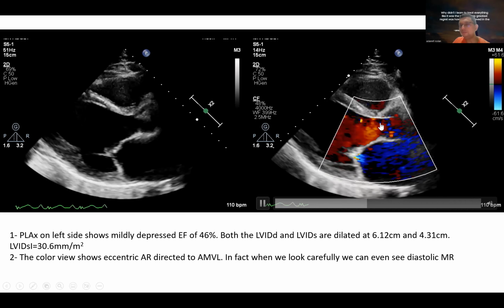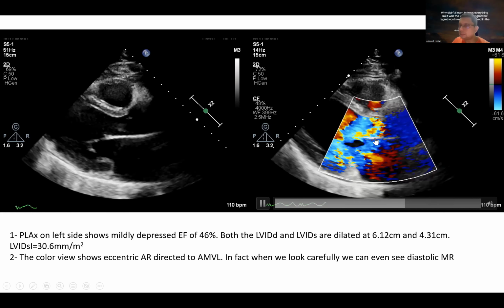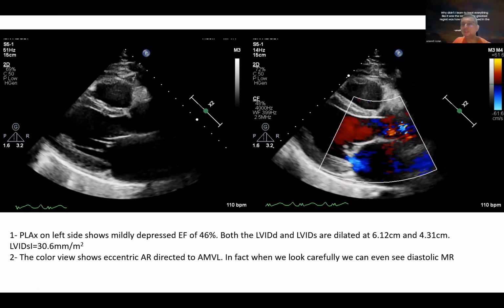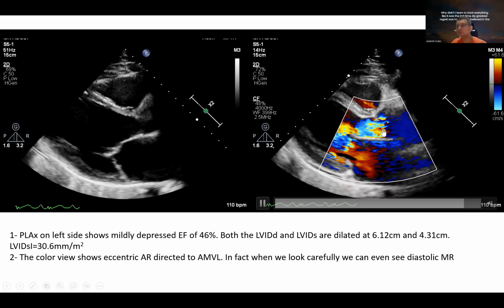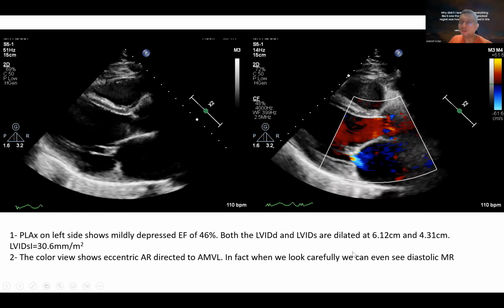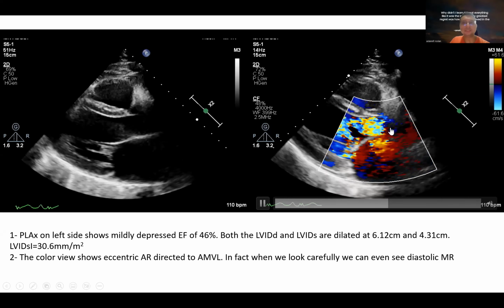ascertain the direction of the AR, because remember, the direction of the AR can give us an idea of the etiology of aortic regurgitation. So, for example, a central aortic regurgitation is normally due to degenerative calcification, like in old people with a calcified aortic valve, or rheumatic aortic stenosis, or someone with a dilated aortic root. Then you will have a central directed jet. An eccentric jet is most commonly due to a flail or prolapse of the opposing leaflet. It can also be due to infective endocarditis or rupture of a sinus of Valsalva.